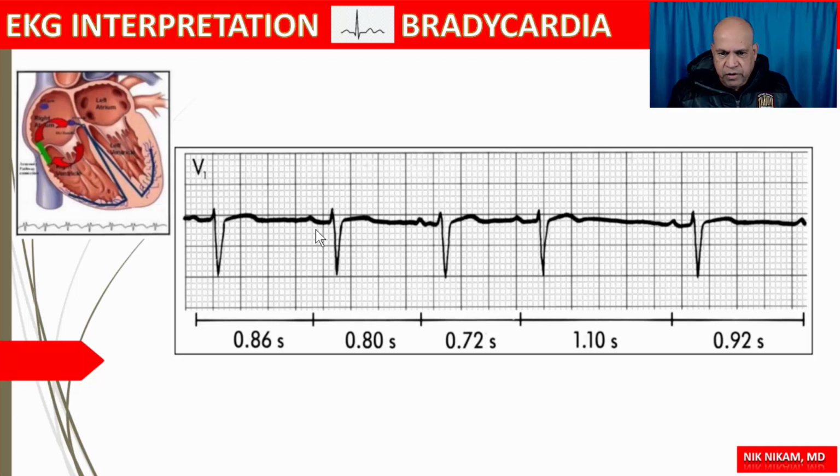Here the T wave morphology is similar in these 3 beats, and here it looks a little different. So whenever you see this, you always wonder, is this representing a premature atrial beat which is blocked, with a compensatory pause following that normal looking cardiac cycle? Whenever we see pauses, we should always think about ectopic beats creating the pause and thus resulting in bradycardia.